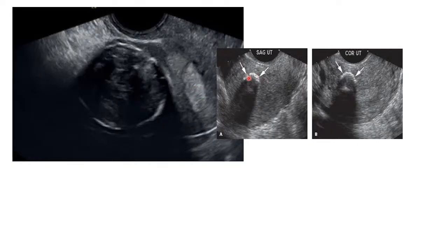Again, you are seeing this tiny, small calcified fibroid. So this is a tiny calcified fibroid. Also depending on the history, you must be very careful, because these can be gossypibomas or textilomas, which are foreign bodies from prior C-sections or other operations, laparoscopic procedures that were done. So a foreign body can present the same, but a calcified fibroid can also present the same.